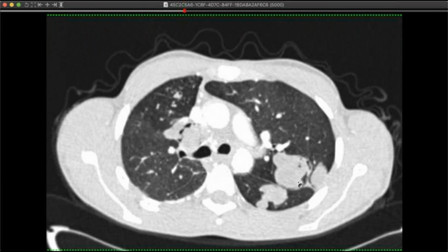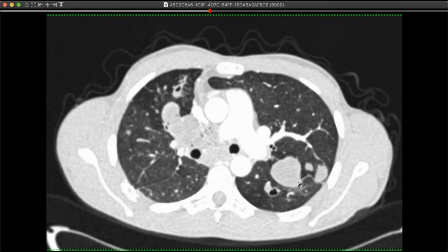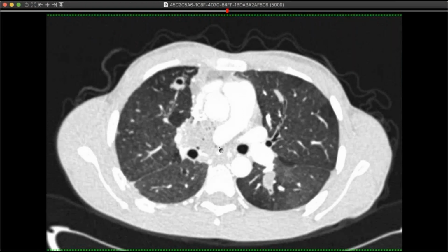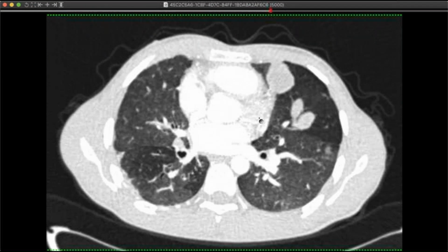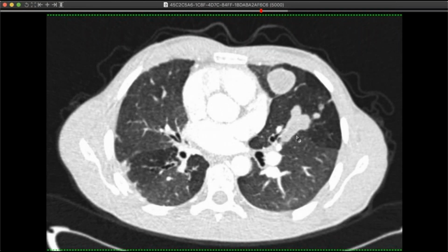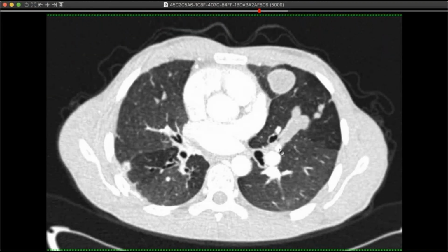This is converted from a movie file, so I can't window and level them, but you can see some of them are very tubular, and there's extension here into the mediastinum. There's gas, and this one's kind of cool here, because I was trying to wrap my head around where these are. We've got a pulmonary artery, this tubular structure, and then the airway.